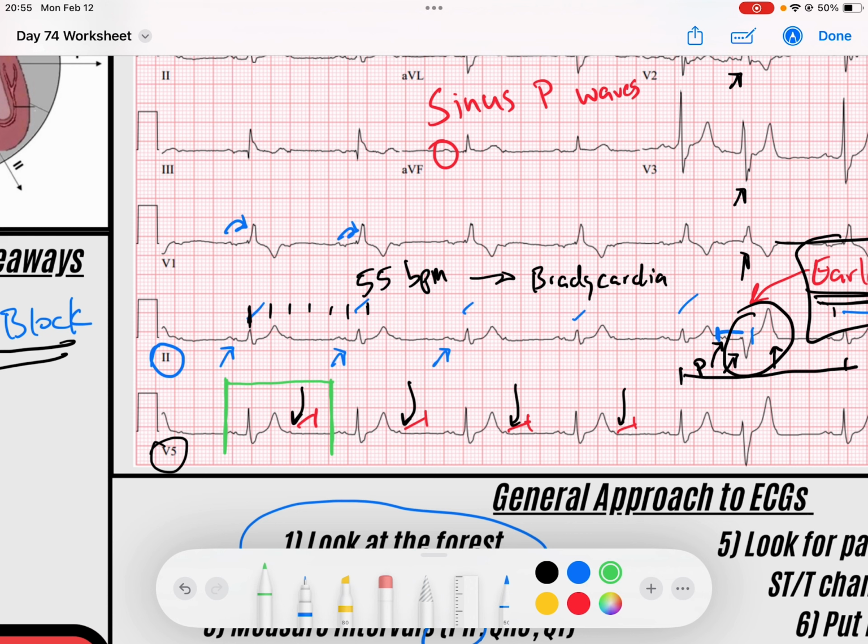And so my test here is to essentially find the exact midpoint here, and we'll draw a line down. And so now we get to see, well, what is going on with this P wave? Is this P wave coming on time? And you can see the likelihood this P wave is probably sitting right there, and I would say that P wave is coming on time.